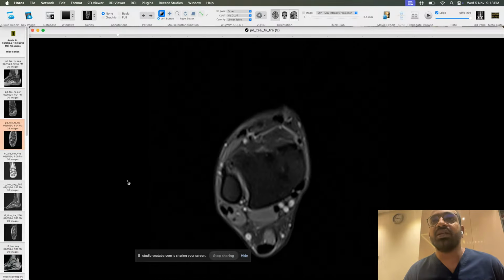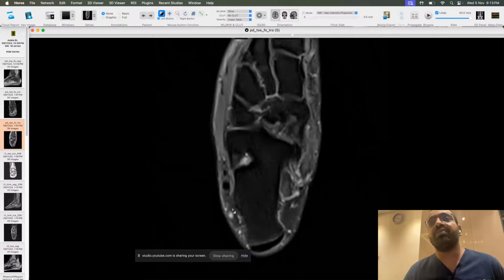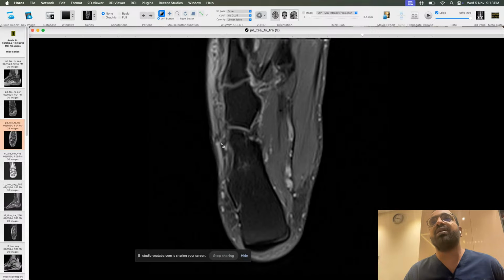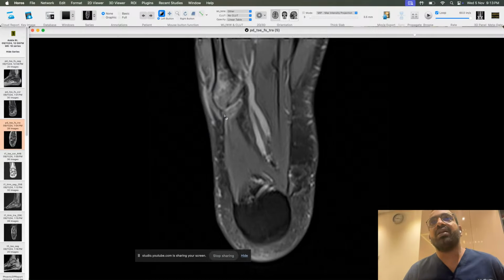The cause of the fracture, if you see, these are the peroneal tendons. There are the peroneus longus and brevis tendons. This is the longus tendon, and this is the brevis tendon. This is the brevis tendon attachment. So there is an avulsion fracture of the base of the fifth metatarsal secondary to the pull of this peroneus brevis tendon. It's not so clear here.